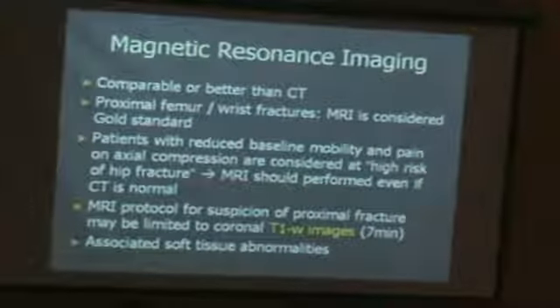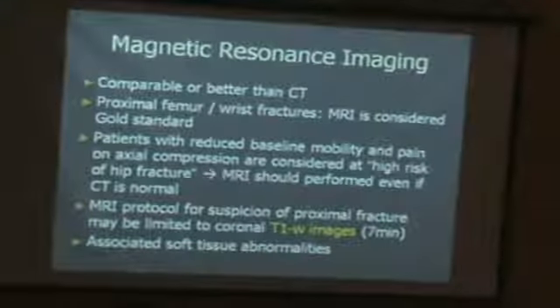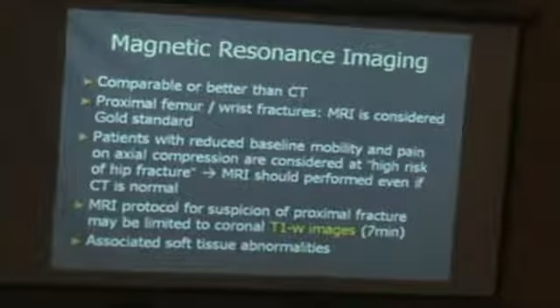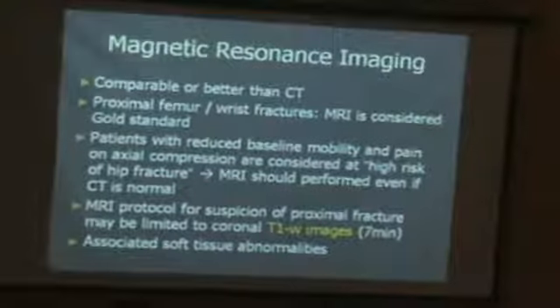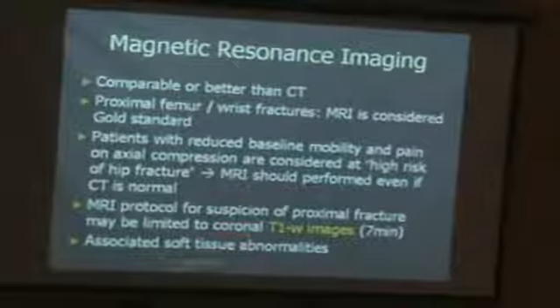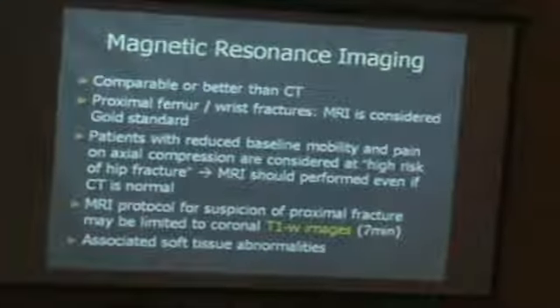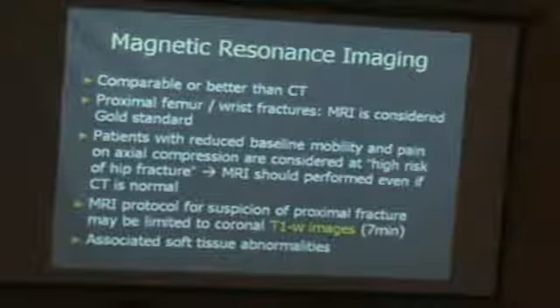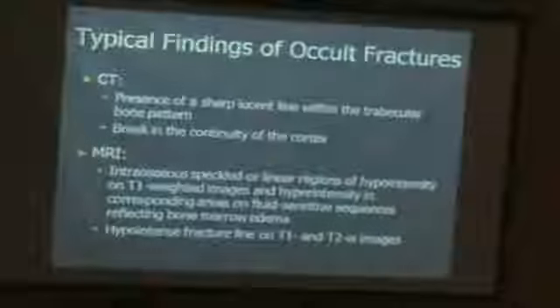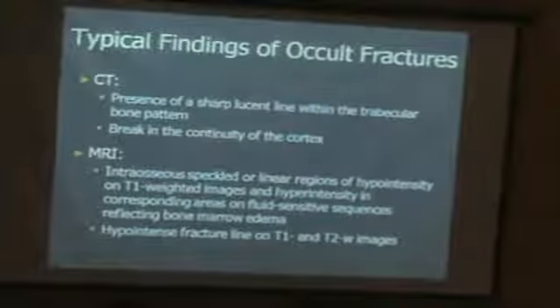Okay, so this is a really unique sequence that is very important and mandatory for this kind of interpretation. Now again, I will repeat that so many times: T1 weighted, non-fat saturated is your best friend for fracture. And as usual for any bone marrow abnormalities, that's really the best sequence. If you need to do one sequence, that's the sequence you want to do. Usually with a fracture, and an acute fracture, you always have soft tissue abnormalities. That's absolutely understandable.